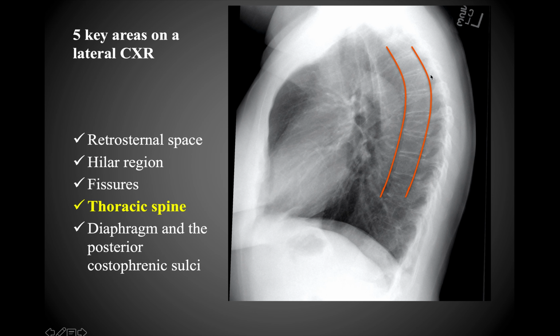Thoracic spine, you'll notice that it's going to appear lighter superiorly and become progressively darker as you move more and more inferiorly. The reason for that is because you have fewer and fewer structures that are occluding or impeding the course of the X-ray beam. In this case, with the scapula up here superiorly, that's why you get this really light appearance, and the humerus as well is going to be to some extent causing the upper part of the thoracic spine to be light, whereas down here where you don't have other structures impeding the X-ray beam, that's where you get a much darker thoracic spine.